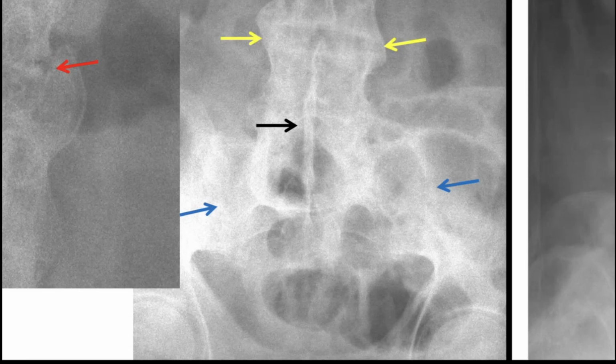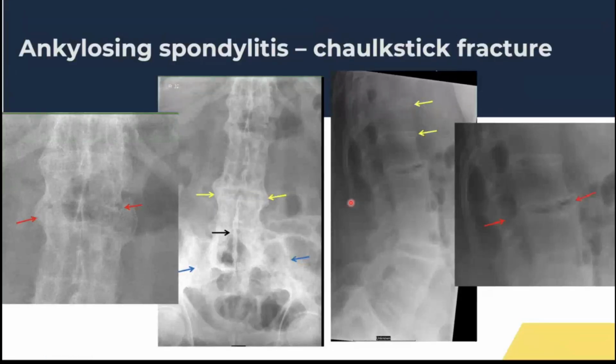And here we can see that the bones are communicating with one another, and that's because the bones have actually fused. And ankylosing spondylitis is a disease of the sacroiliac joints as well as the spine, but primarily of the sacroiliac joints. So this is really advanced ankylosing spondylitis, undiagnosed. Perhaps a patient who's been suffering with back pain their whole life. Eventually, the spine has completely fused, and at the point of fusion, there's no movement there. So if you haven't got any movement, you no longer have pain. And so he's probably just left it as that now.